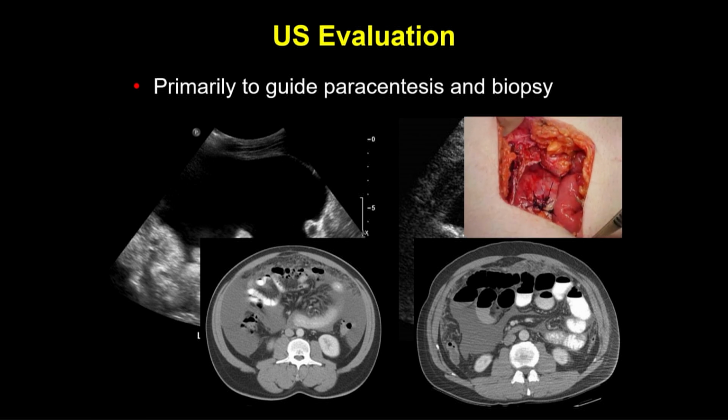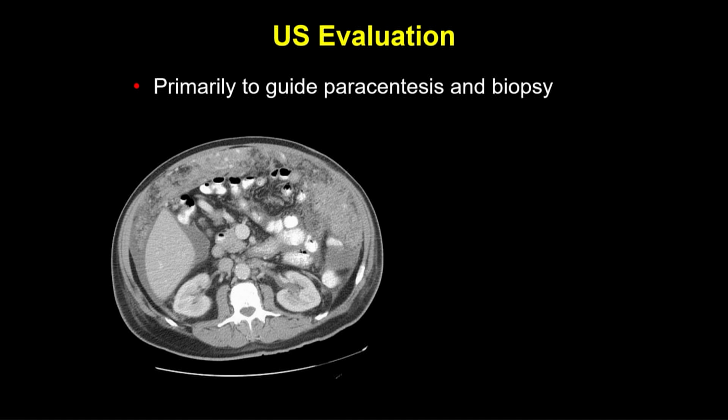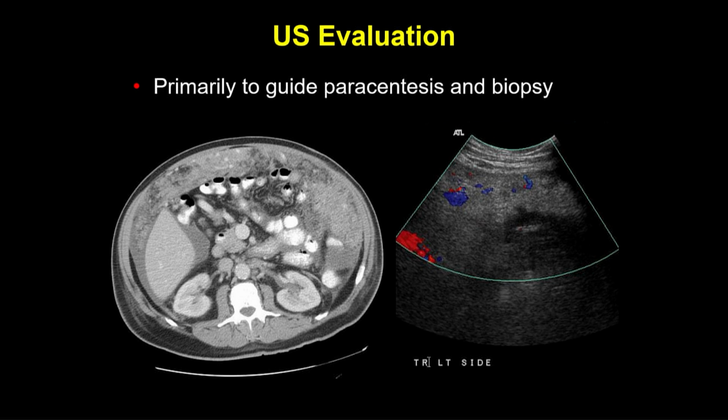And way back then, this patient actually had a peritoneal biopsy, an open biopsy, because they didn't really believe the results that we were getting from the diagnostic paracentesis. Here's omental caking. This is actually not carcinomatosis, but lymphomatosis. Similarly, if you do have this kind of involvement with a sarcoma, you'd call it sarcomatosis, not just to be precise, right? They're not carcinomas if they're a sarcoma or a lymphoma, but this is lymphomatosis.